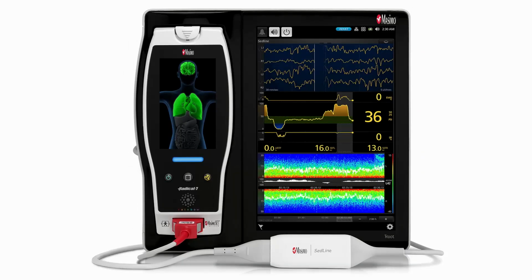Administering a medication based on the clinical response to pain and the depth of hypnosis becomes a promising future. Nociception level index, bispectral index, and SED line are tools that allow the anesthesiologist to assess the response to pain and the depth of hypnosis during a general anesthetic. These systems aim to modify the infusion of drugs in the event of a response, making them the future pillars of any navigation system.